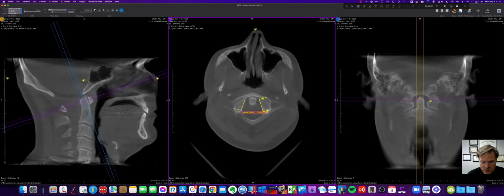Good. Okay. A little messy. Outside edge.